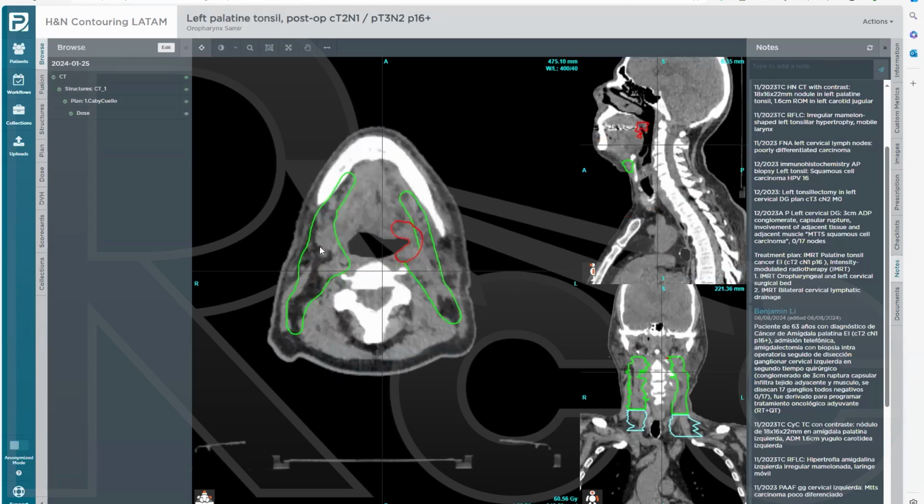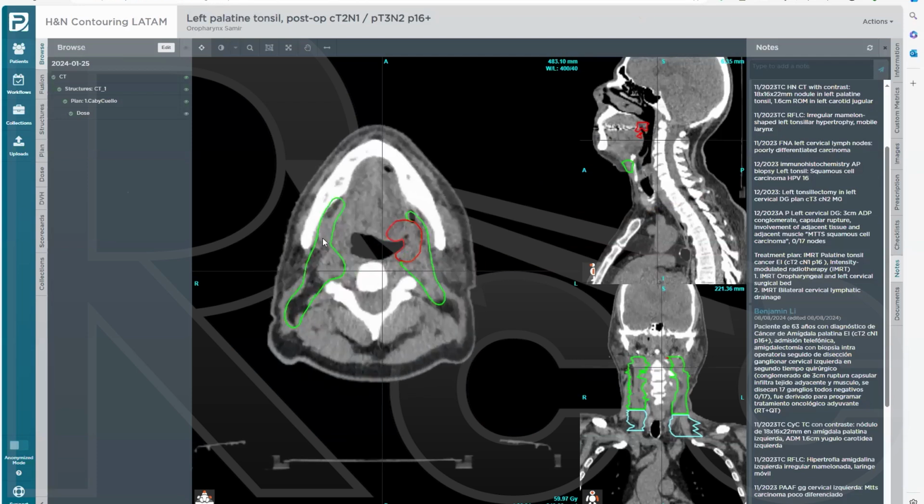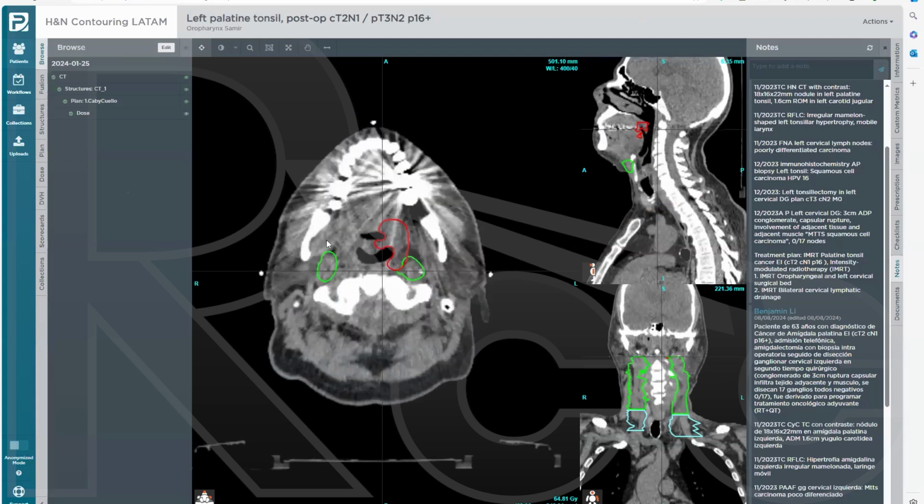Yes. So see, when people are drawing, they're trying to draw maybe 1B here if they needed to, right here, because it's a submandibular gland. But above, it's important to know this is the medial pterygoid muscle.